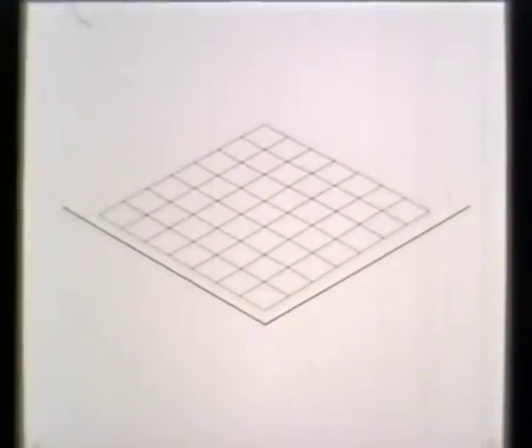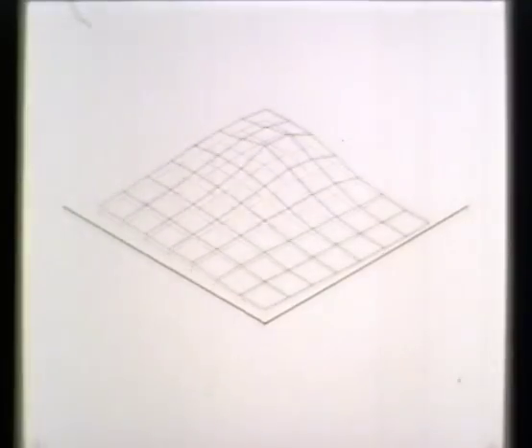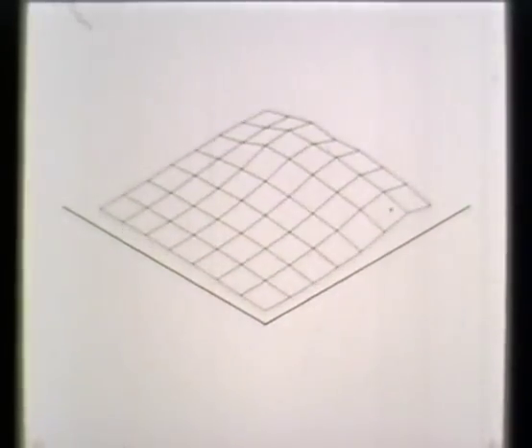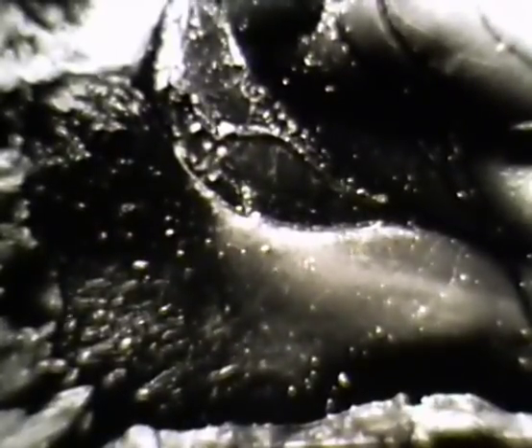Following the pre-stimulus baseline segment and the shock artifact, the response begins at the anterior part of the bulb and spreads to the posterior part. Thereafter, the oscillation persists within the region of initial activation. It does not spread outwardly like waves in water, but dies in situ.